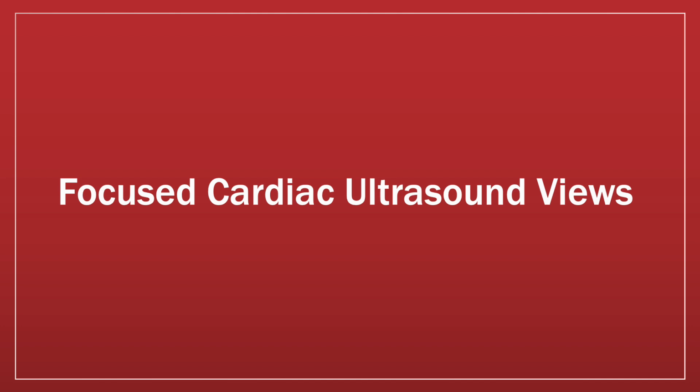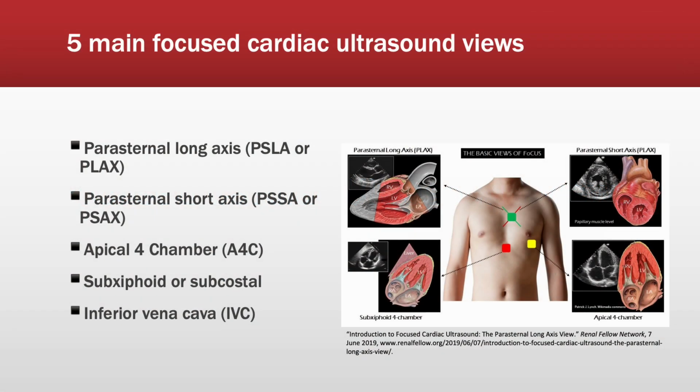Finally, let's take some time to talk about the nitty-gritty of the different focused cardiac ultrasound views that you need to obtain to have a complete bedside point of care cardiac exam. Here's a quick overview of the 5 main point of care cardiac ultrasound views that we're going to be discussing today and their widely recognized abbreviations.